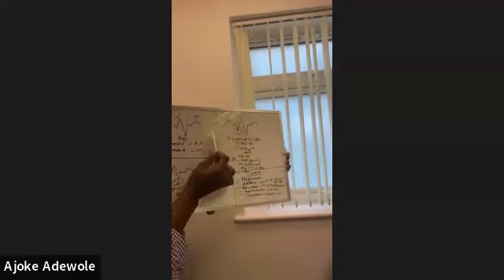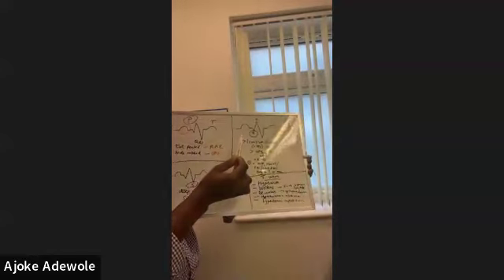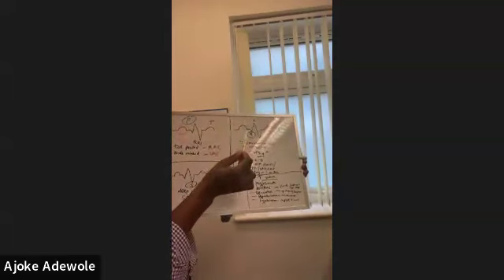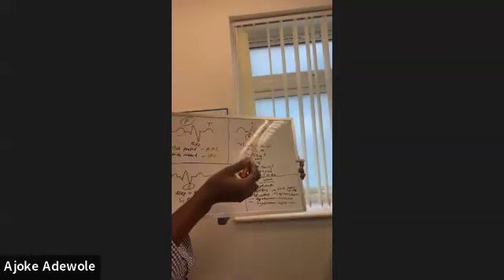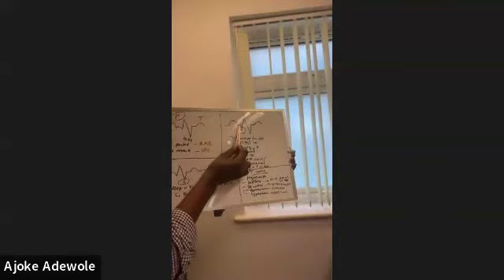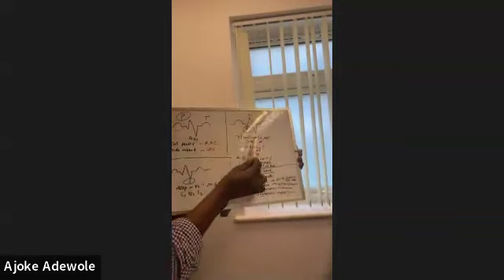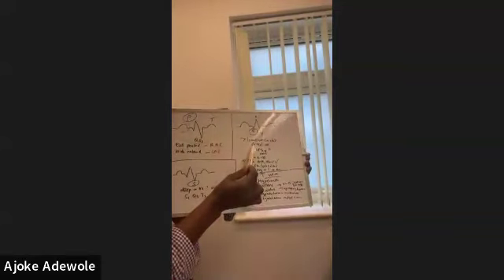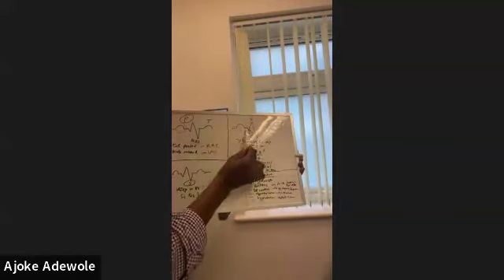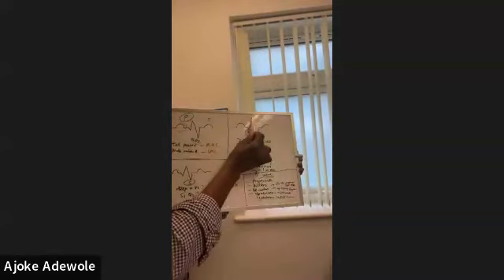Then there is the Q wave. The Q wave, many times, isn't a problem, but it can be a problem in the sense that it can signify that an infarction has occurred. And when I mean infarction, death to the heart cells has occurred. And as you can find, this Q wave should be short and concise, but it should not be more than one small box, which is usually 0.04 seconds, right? But if it is greater than one small box, or it is wide, becoming very prominent, or it's more than 25% of your R wave.